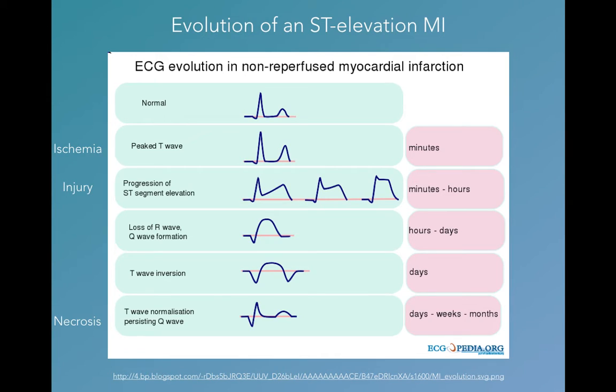and that just means that the patient's in trouble, because there are other causes of ST elevation like pericarditis or variant angina. So tombstoning is different. And then further down, you can follow the progression to necrosis, and that's when you'll see the Q wave really become significant. And that occurs later.